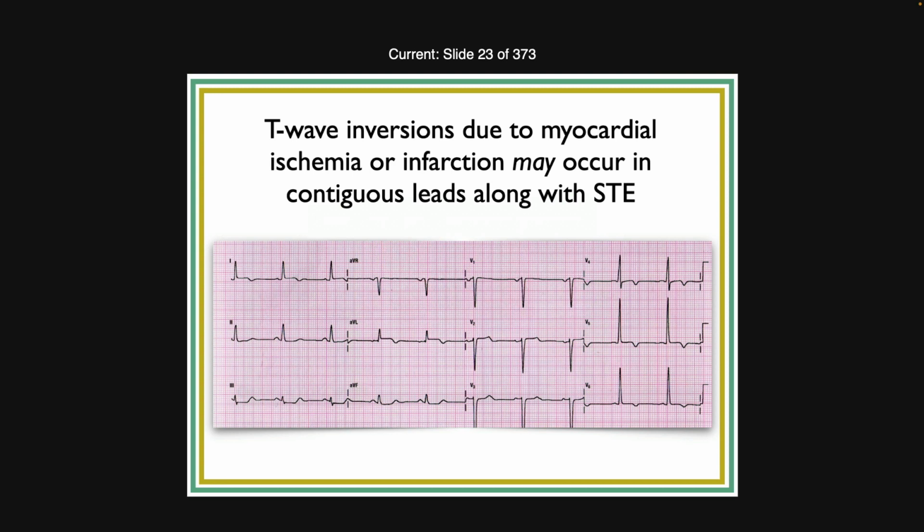Is there a hand in the back row, Cody? That's what I was just going to say. I thought I saw some elevation in V5. Slightly, it's very, very slight. It's not a full millimeter, but you're right, it just looks like it's going to happen, and the T-wave inversion is also suggestive that something's going to happen.